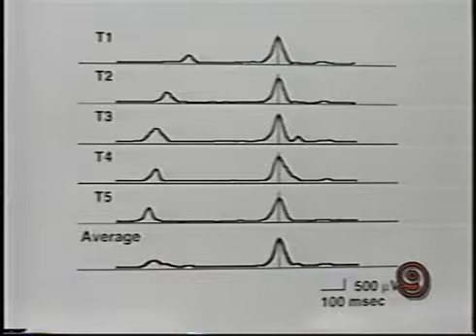Here we see several smooth data traces and some average data. Averaging signals from several repetitions or tokens of an utterance helps us get general information about muscle activity. First, the signals must be aligned and then the average calculated. Here, each token is aligned at the peak of the second burst of activity, which is marked by red vertical lines, and the resulting ensemble average signal is shown at the bottom in blue.